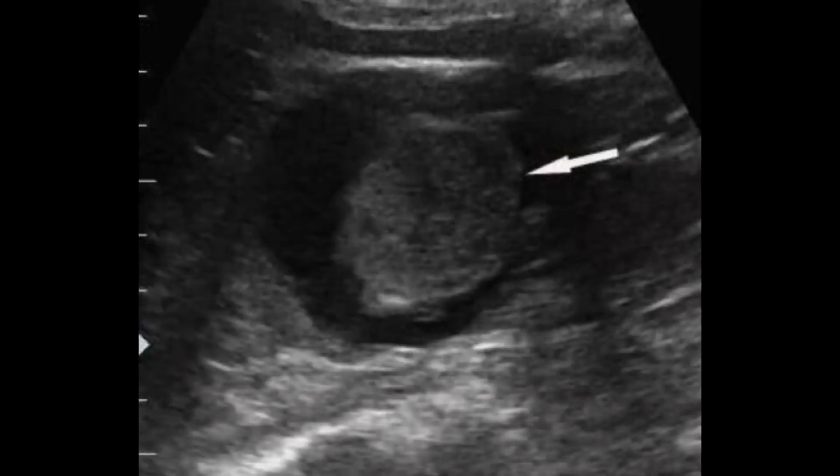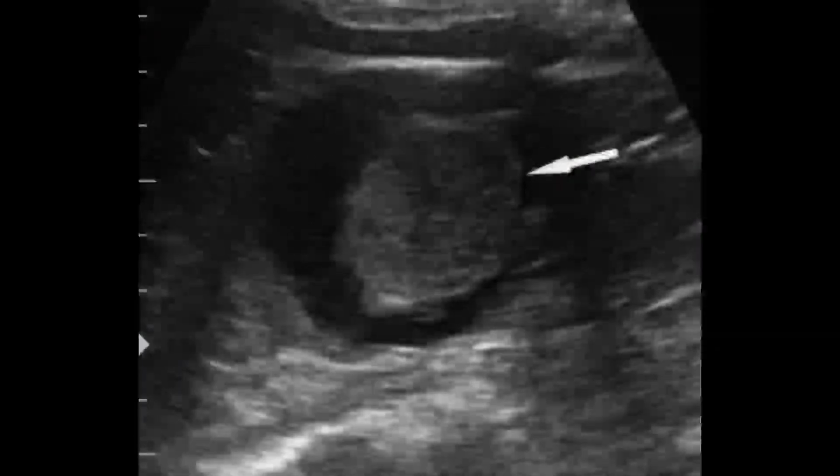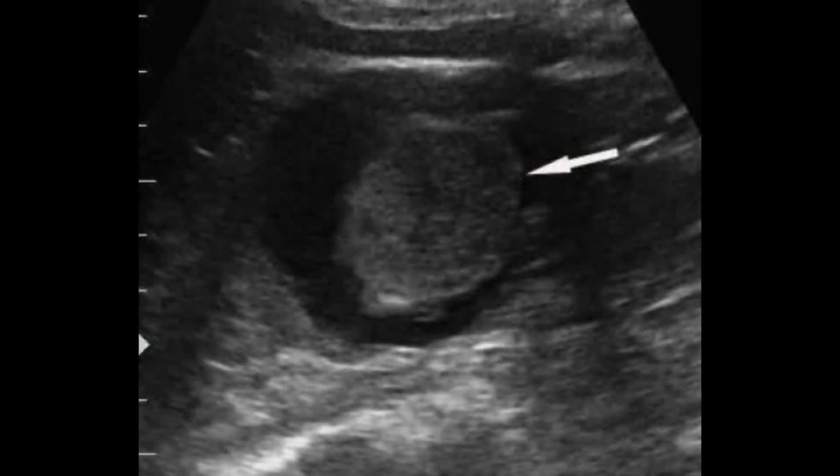And the last category is category 4, and that is an absolutely malignant cyst. On ultrasound imaging, if you come across any intraluminal solid nodule, you must think of category 4. And if there is a nodularity within the cyst along with vascularity on Doppler imaging, this would be considered a 100% malignant cyst, and this should be confirmed on contrast enhanced CT images.